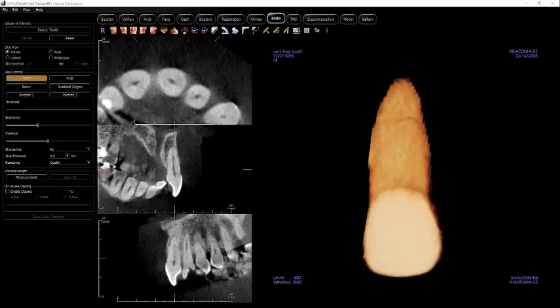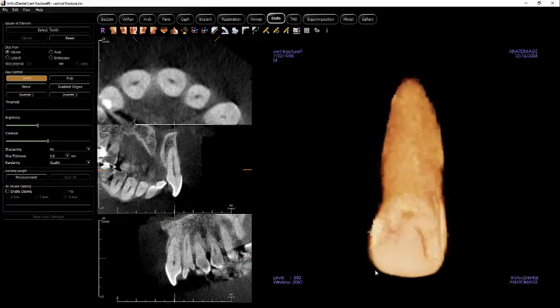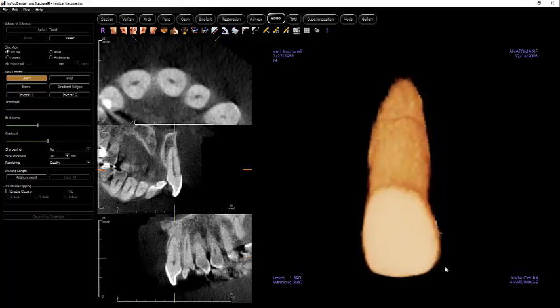Again, click on the side to be removed. Once the volume of interest is refined, we are able to make working length measurements and examine the region more clearly. The Endo Tab offers a unique working length measurement tool to simulate the file length and tooth measurements that are taken manually during endodontic procedures. Click on the Measurement button or the Working Length Measurement tool to get started.